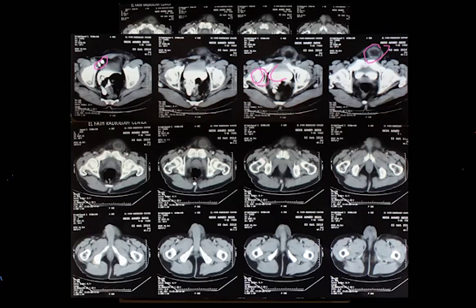يبقى زي ما انت شفتي كده دي inguinal hernia فعلا. بس بصي على البلادر كده، شوفي البلادر وشوفي دي sliding hernia هنا خارجة. يبقى you've got this impression like I've got. Yeah, I may be right, may be wrong, but I very much think that this is a sliding hernia. صح. There's a suspicion of sliding hernia. Why did you say so? وانت هايلة يا شهيرة. Why did you say so?